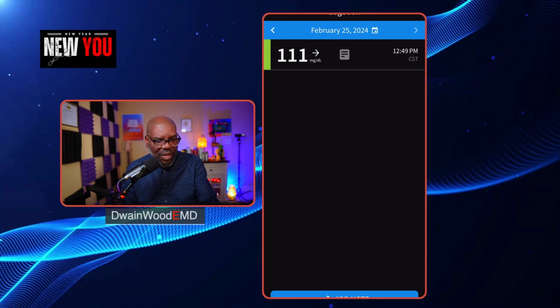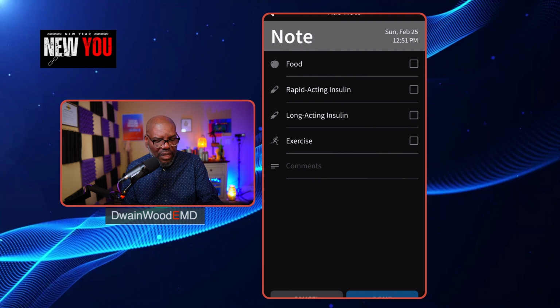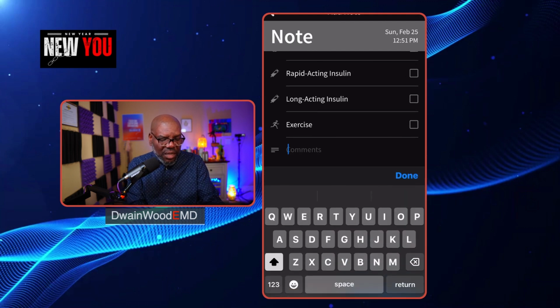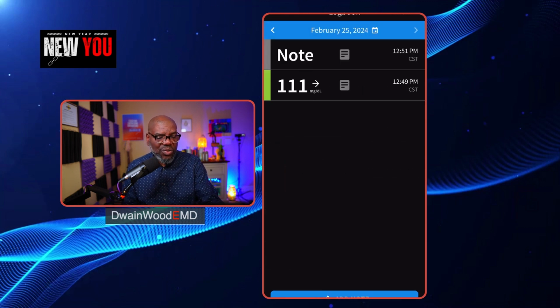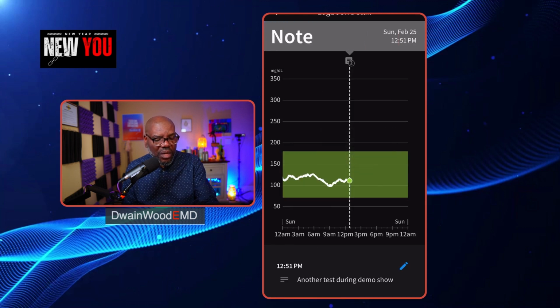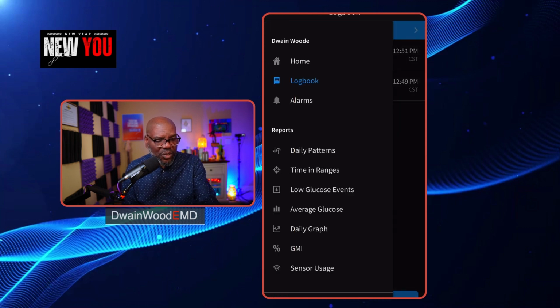So let's add another note, and that's the time. I'm going to say "another test during demo show." All right, so when I did that, say done. Now I've got 2 of those, and I can go back and it'll go directly to that. Now, notice that it didn't change the number because it essentially is the same time. So that's the logbook.